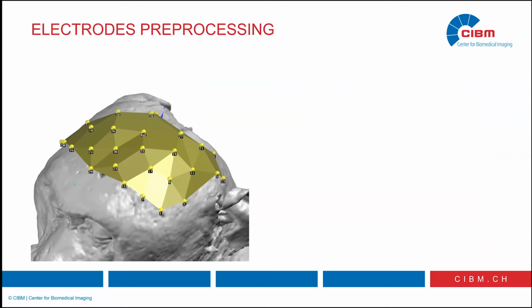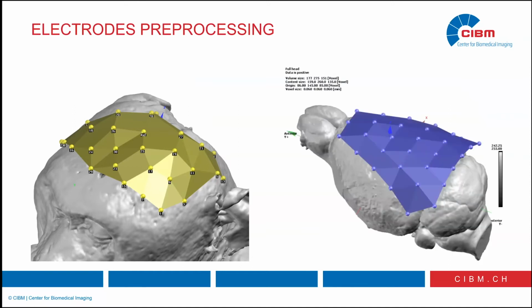Oh, what do we have here? We also have some monkeys, because we also use the toolbox on rhesus macaque, and we also made a prototype on the mouse. Of course, the electrodes are a very tiny set of electrodes. It's a grid on top of the mouse head. So we can use the same package, and we can use the same toolbox to co-register this very special case. So a monkey on the left and a rat or mouse on the right.